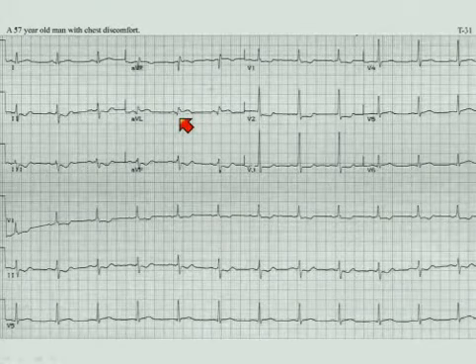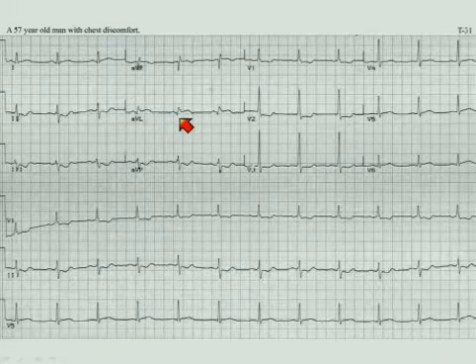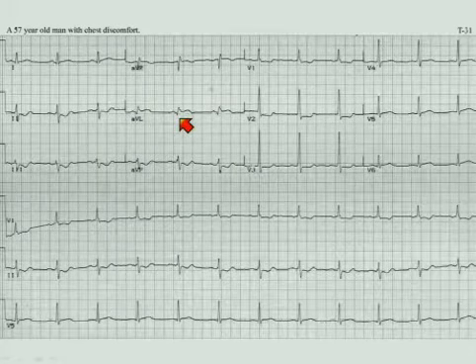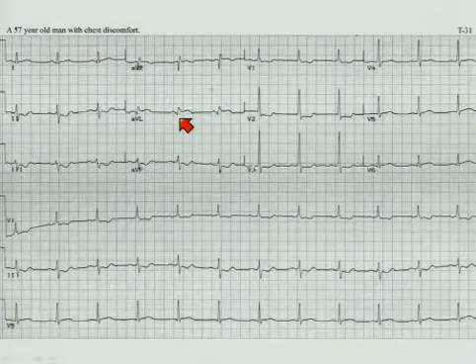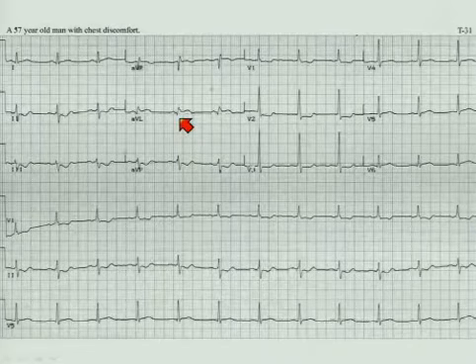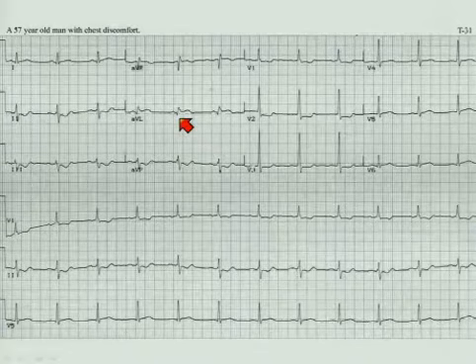Whether that's the amount of myocardium involved or where it is relative to the standard electrodes, I can't tell you. But the current of injury with circumflex lesions is often not as dramatic as it is with other totally occluded vessels. But this is an important pattern to recognize.